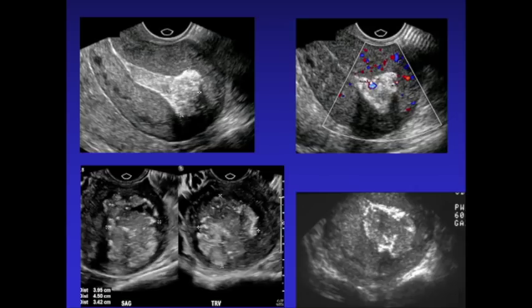Whether it's an accreta or an increta, we don't really care. But this is a patient who probably will not do well with a D&C, because if they try and scrape this and get the whole thing out, you know they're going to rupture the uterus. There's no way they can get this otherwise.